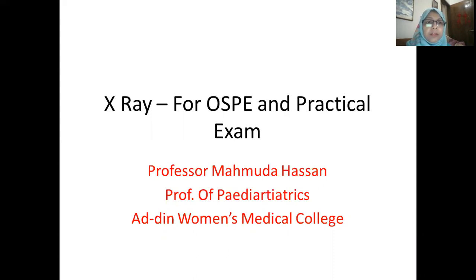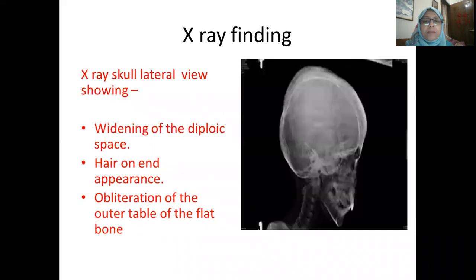Today, I'm going to take a class on X-ray with OSPE and practical exam orientation. This is Professor Mahmuda Hassan, Professor of Pediatrics of Ad-Din Women's Medical College. This is our first X-ray.